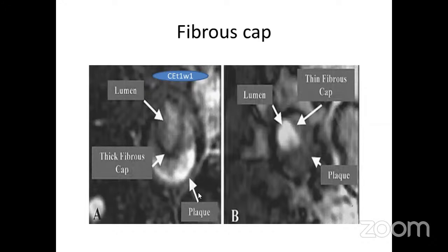There is also evaluation of the fibrous cap. As mentioned earlier, the fibrous cap can be thin or thick. We can clearly see the lumen and the thick fibrous cap with the plaque here, and here the presence of a thin fibrous cap.